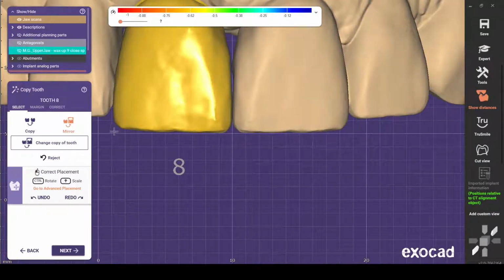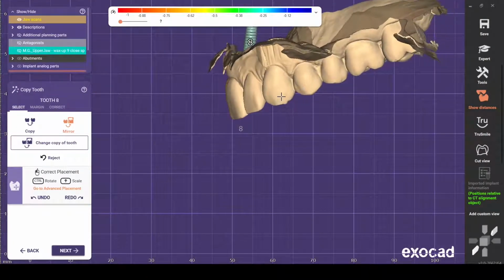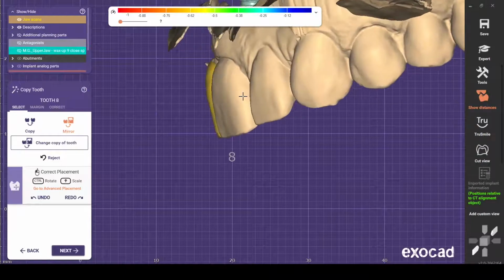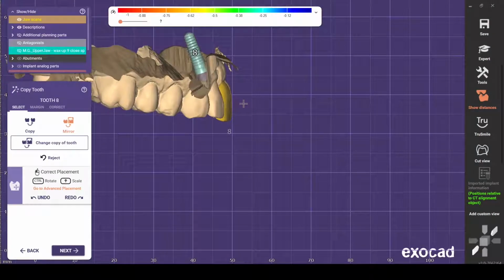See how this is coming up a little bit more? So I'm going to hold control and rotate this just a smidge. Bring that down. I think this needs to come down just a little bit. Okay, I like that. And then finally, look from this view and make sure that these surfaces are disappearing at the same time. That looks great. Check it from this view. Good.